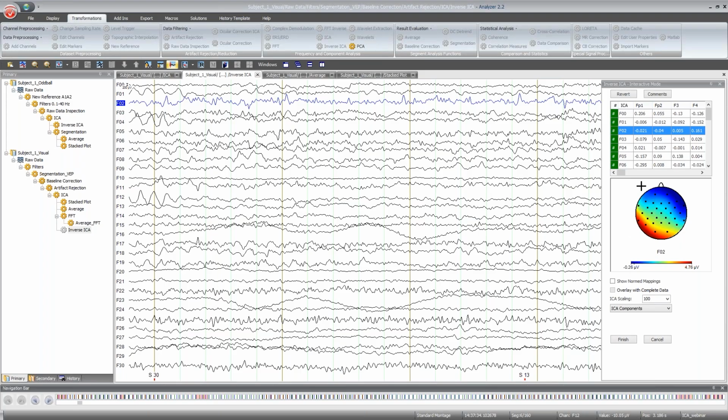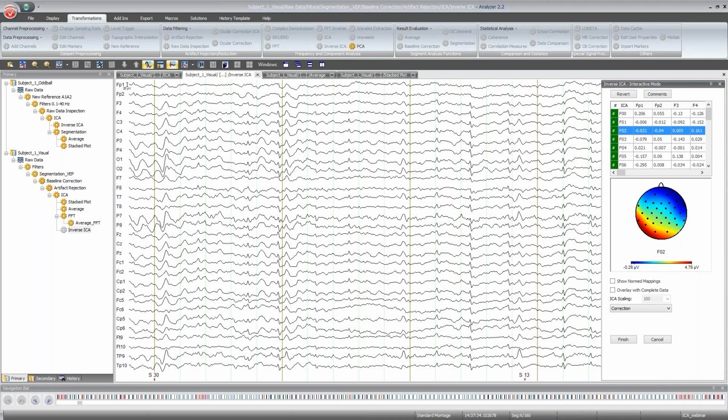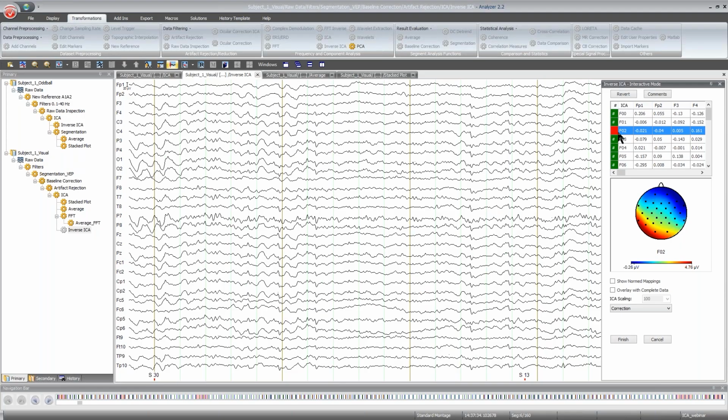And so if I take this out now here, and I go through the correction first, here you see it also in the data, you see that there is definitely some pulse in here. And if I now double click, this will be taken out. So as you can see, ICA can decompose all kinds of artifacts, and you can also get rid of these artifacts.